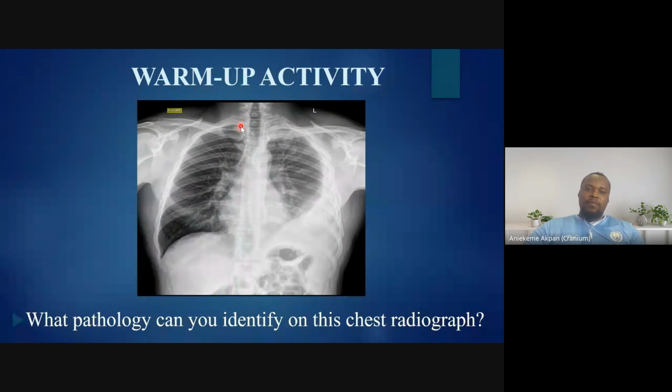And if you look at the breathing, the breathing is adequate. We are looking at the lungs parenchyma itself, and we can see the normal vessels within the lungs. We can see the hilum. We can see the lungs is well inflated on the right. Now, if we go to the left, we also see the markings, but we can't see the entire lungs. And then we just keep that one side.